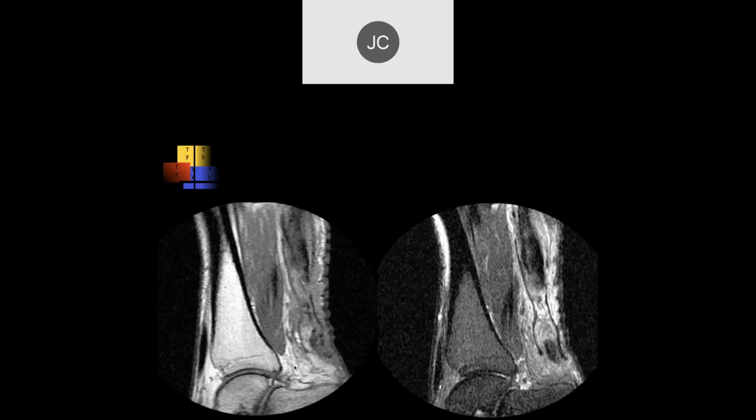Here it looks like there's some pretty high grade tearing of that distal Achilles tendon. And there's some peripheral low signal fibers that may remain intact there, yeah. So there are a lot of different surgical approaches to the Achilles tendon. And when there are a lot of different approaches, it means that no single one is really all that effective. So people have tried a lot of different techniques. One technique to try to strengthen the repair is to sacrifice the plantaris tendon, unwrap it and use it as a collagen wrap around the tendon.